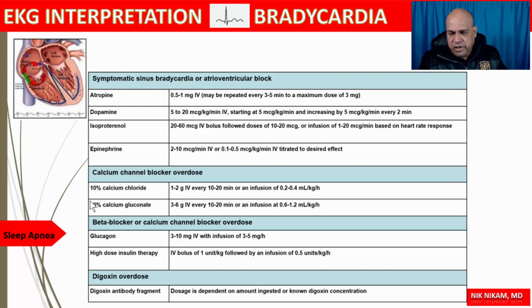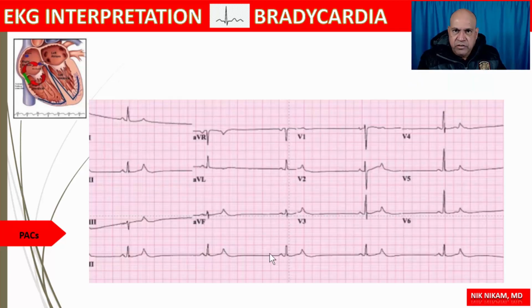So this is an important table to keep in mind, because you can get several questions related to treatment of bradycardia, especially the doses and the drugs. Okay, can you take a guess? This is just a trick. We already saw this electrocardiogram. We talked about this little notched T wave, which may perhaps be atrial bigeminy causing bradycardia. Let's move on to the next one.